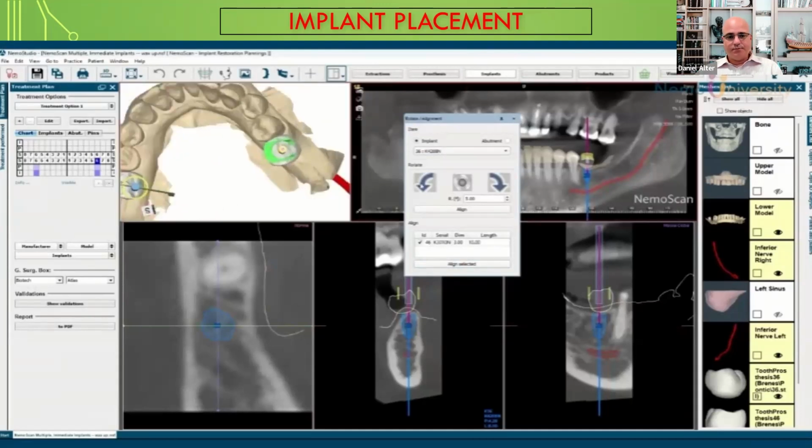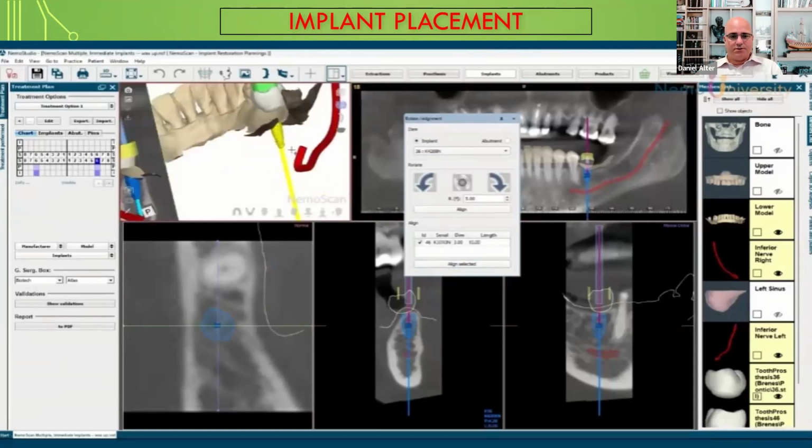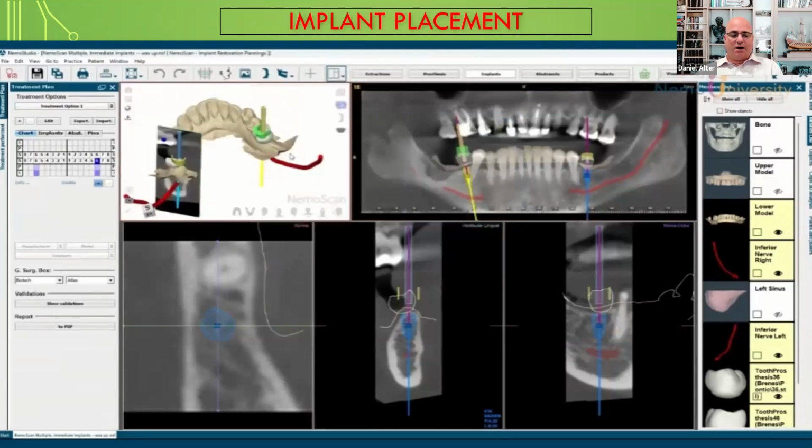So here again, it's showing even down into what kind of sleeve you need and what kind of mechanism it is that you want to accomplish. And everything is within your control. So they have these libraries, if you will, that you can toggle back and forth. You can rotate if you want a plastic sleeve, or if you want a metal sleeve, if you want it glued, if you want it pin glued. You have all the options. And again, it's very dependent on the type of implant system that your dentist is going to select, but you have it at your fingertips.